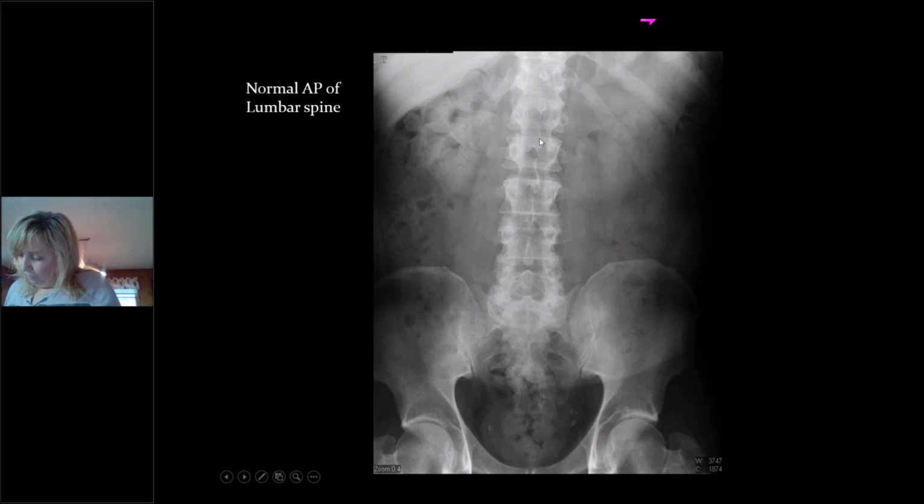When you count these down, you've got the rib at 12 and then L1, 2, 3, 4, and 5. Watch the numbering. Sometimes a person will have a transitional vertebra and might have a 6th vertebra. That's only about 10% of the time. It's really only an issue if you're worried about operating or doing a procedure. It's not a pathologic thing. It's just an anatomic thing.